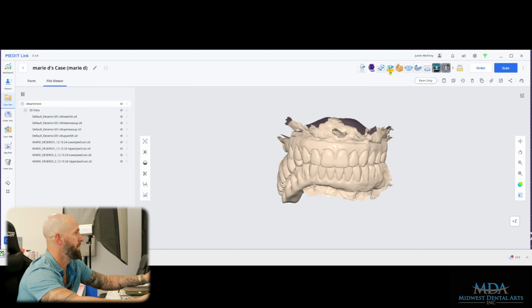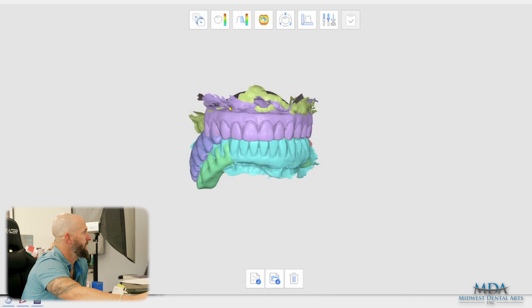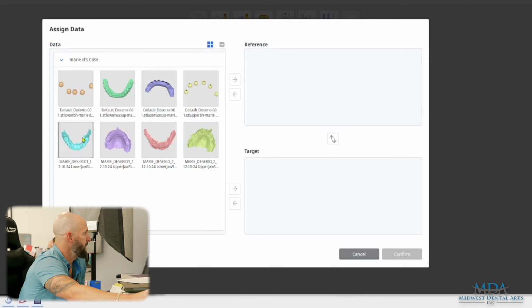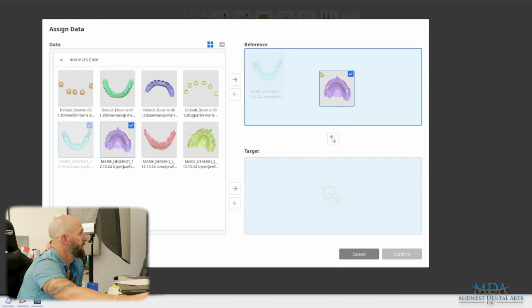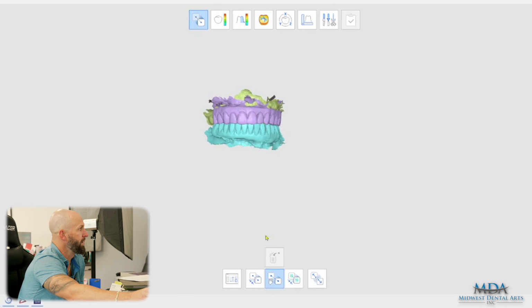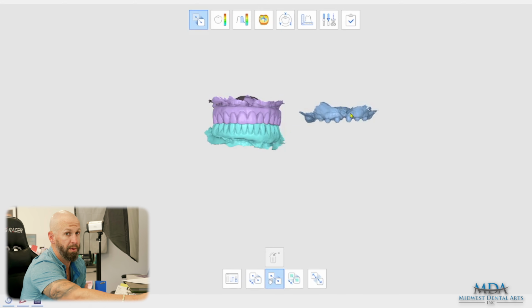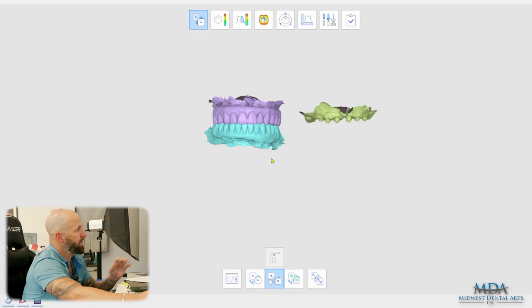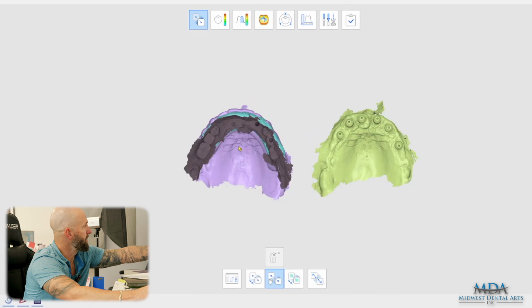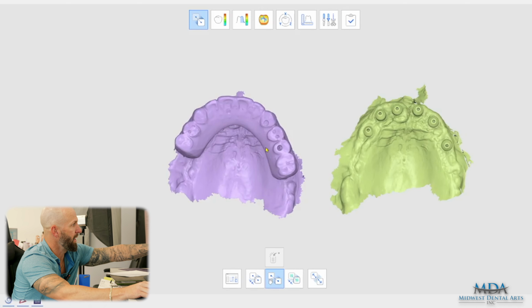Go into Medit Design. And so now, when I'm looking at the scans of the provisionals, I've got the photos. I'm going to take and move provisionals, and then I'll do the single upper tissue down here. So I get this question a lot. It's like, okay, I have a patient in temporaries. Maybe we never started the case. I always like to have scans of the temps, and you can see, look at how much palate we have here.